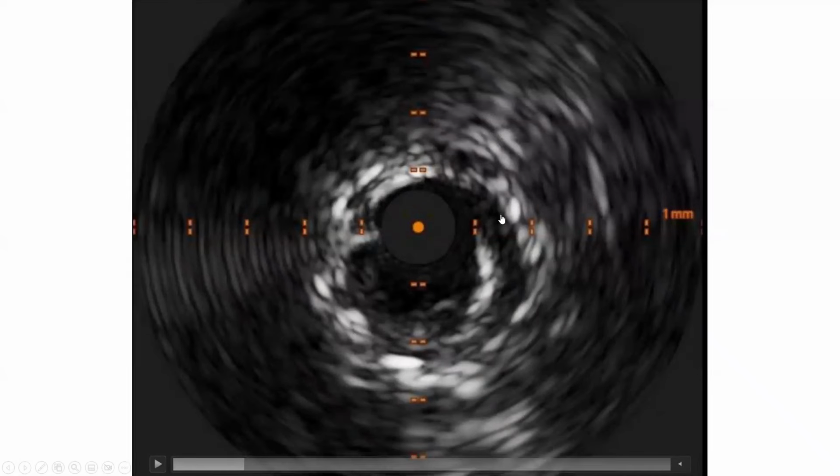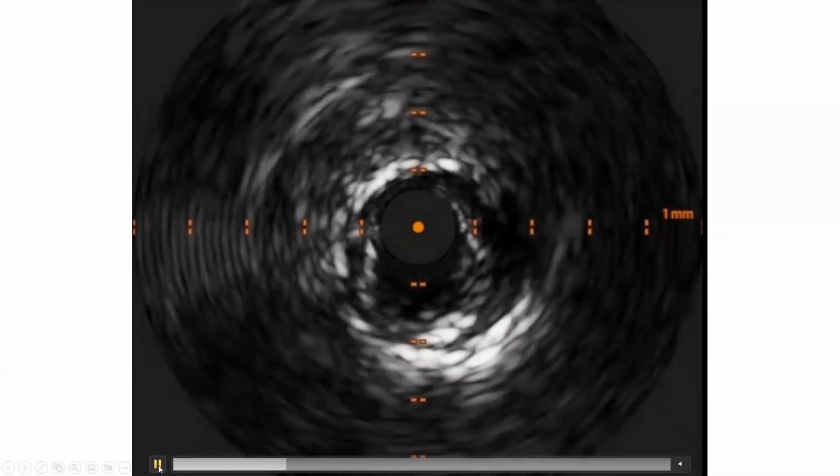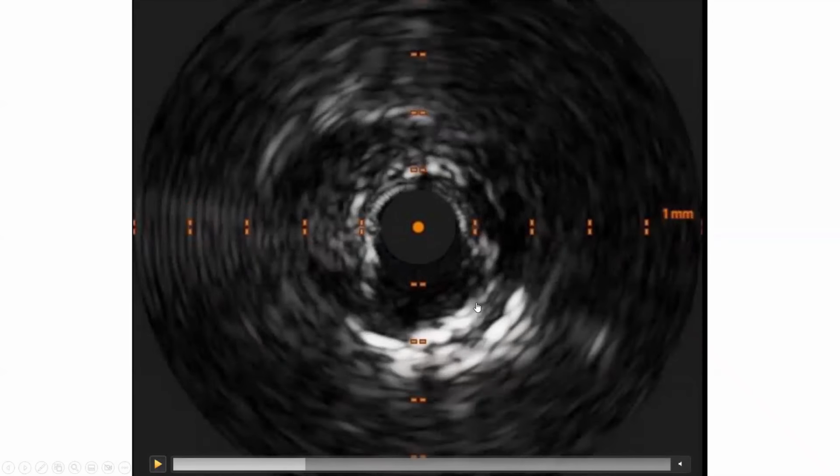And inside that, you see a soft neoatheroma and calcium specks. You see calcium in that neoatheroma at the surface of it. So you're already seeing calcified neoatherosclerosis. This is further up in the stent, and here you can see neoatheroma without much calcium. You see the 2 stent struts well apposed. The issue is inside it, neoatheroma. You keep running, and here you see heavily calcified neoatheroma. This here is heavy calcium.